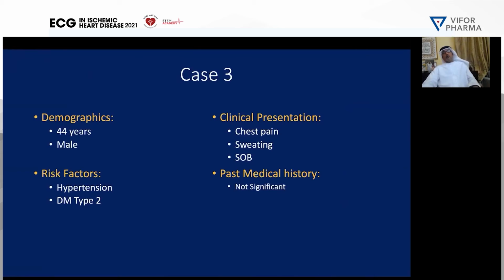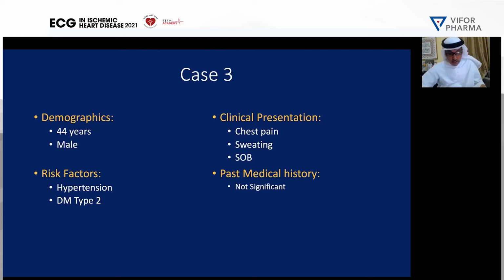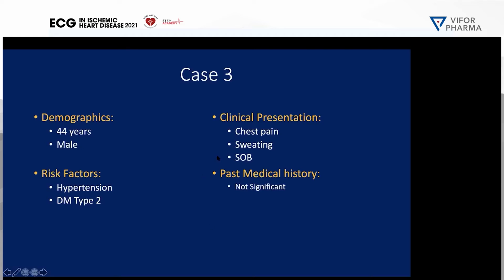Any comments or messages, Dr.? No, Dr. Bakir, Dr. Zubaidi, I think this is very clear. But as we said, we have to be sure whether it is a new onset or old onset left bundle branch block to decide what we are going to do. Okay, excellent. Now let's move, yes, let's move to case number 3.